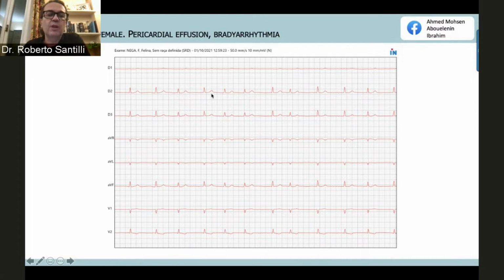Because usually when you have pericardial fluid changing the ECG amplitude, you also have a change in the ST segment, the T wave, and also in the area of the PQ. Here you don't have P because it's a fib, but still you would have changes that are usually present in case of pericardial effusion. So I think Brody effect, since it's related to the change in the RR interval, is the more probable diagnosis.